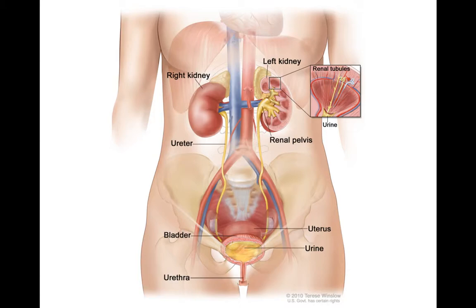We are all familiar with this. Ultrasound can be used to scan this. If the bladder is distended with urine, it will be easier to identify. For the ureter, it is difficult or impossible to scan in normal situations, but in pathological dilatation, ultrasound can be used to trace down.